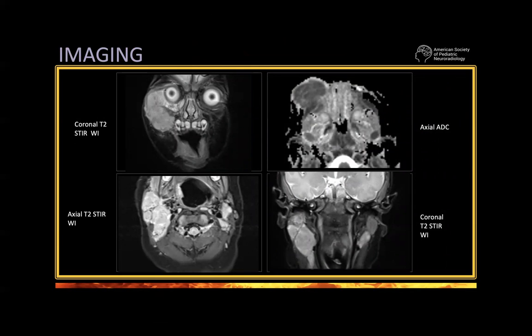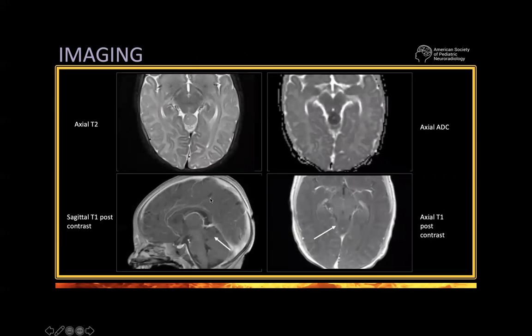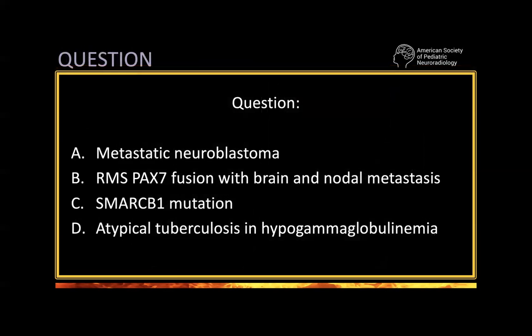This is about the pineal and a sellar region tumor, so there is something going on in the brain for sure. We look at the brain and we have an embryonal-looking tumor. Why is it embryonal? A very young patient, no enhancement, striking diffusion restriction. Trust the restriction first, the diffusion first, in the differential diagnosis. And what is your diagnosis?